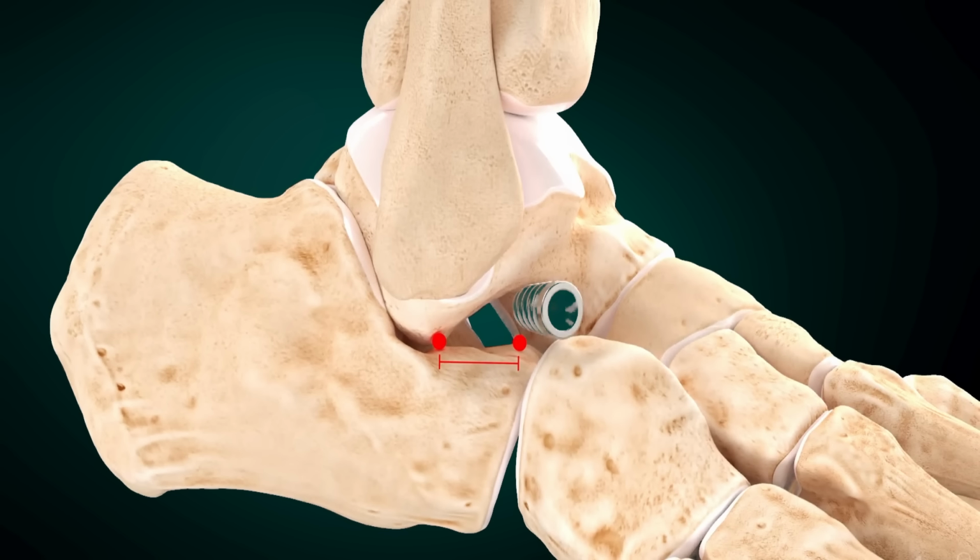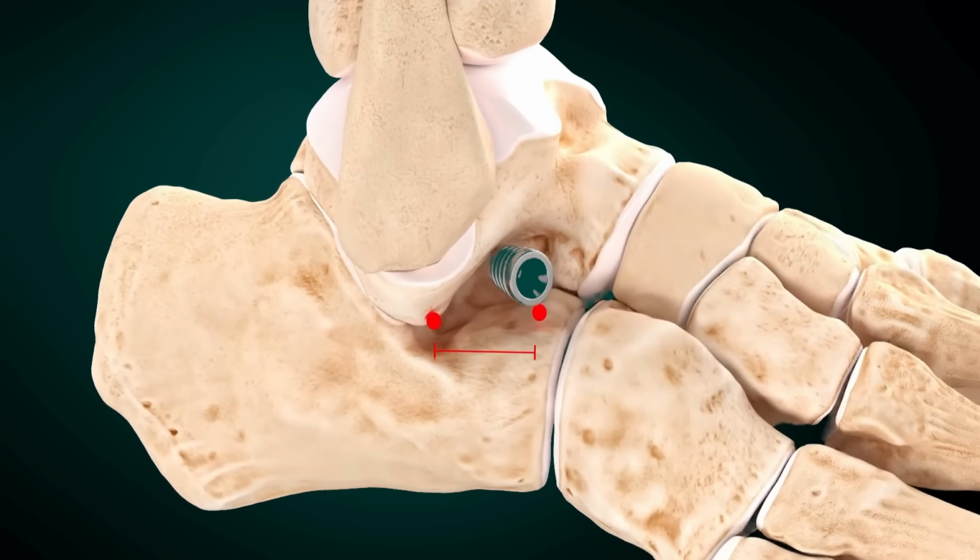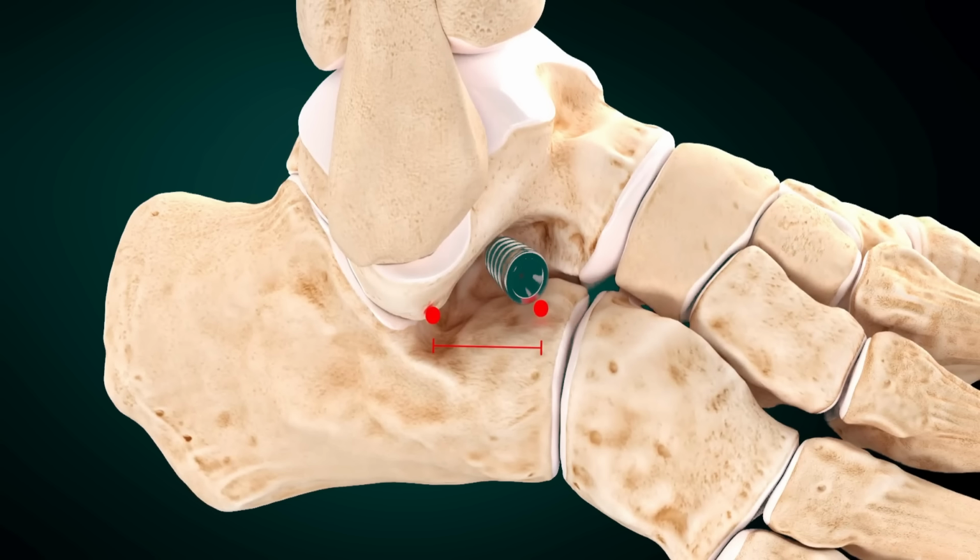The Prostop subtalar arthroereisis implant functions as a free-floating splint in the sinus tarsi. It prevents the approximation of the two processes of the talus and calcaneus, correcting the anterior translation of the talus over the calcaneus. Simultaneously, it forces the calcaneus out of hypereversion, positioning it back in its physiological position under the talus. As a result, it also facilitates the relocation of the talus in its physiological position above the calcaneus.